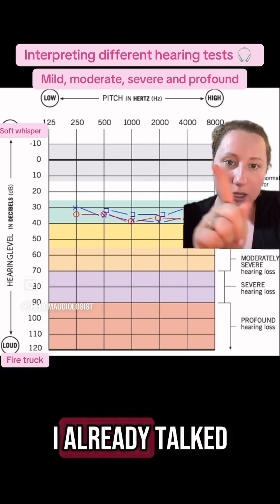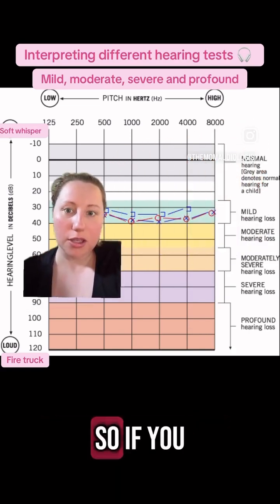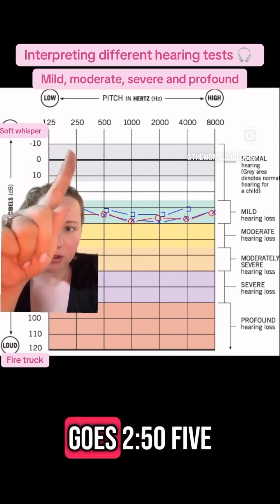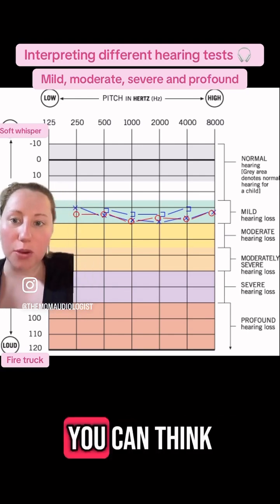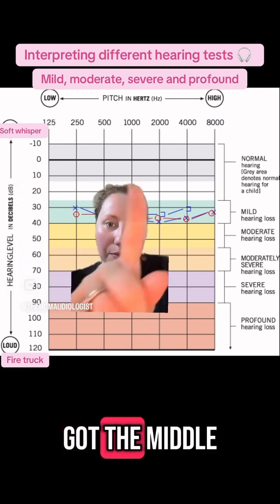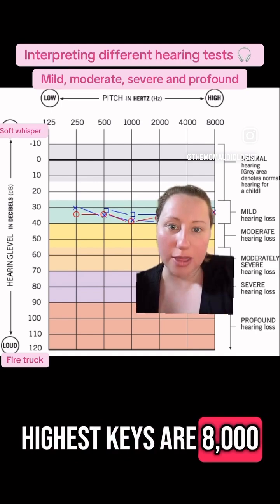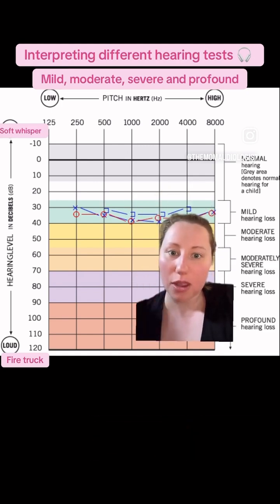Now, I know I already talked about frequencies, pitch levels, but it is like a piano. So if you see up here, the 125, and then it goes 250, 500, 1,000, and so forth, you can think about that as keys on a piano. The lower keys are over here, you've got the middle keys at 1,000, and then the highest keys are at 8,000. That is in hertz, Hz.